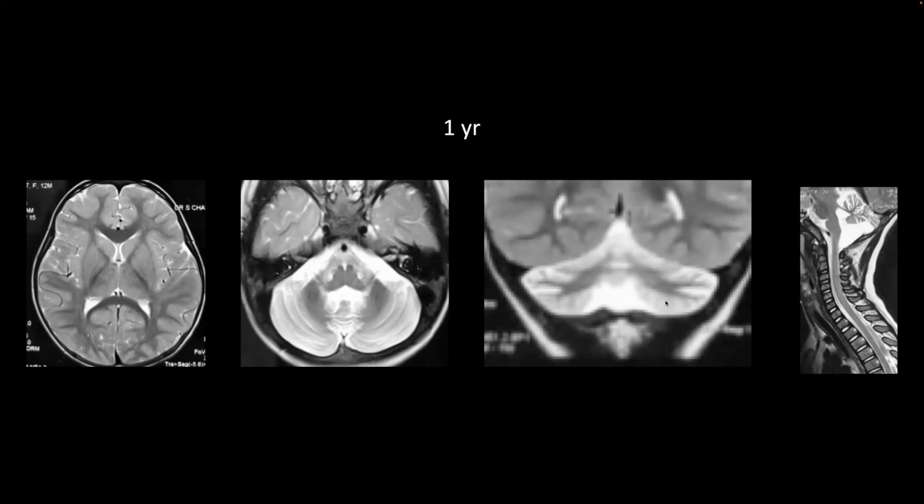I think the cortex is also slightly hyperintense on the T2 sequence, better appreciated on the coronal sequence over there. The spinal cord, at least the cervical and the upper thoracic cord, did not demonstrate any volume loss. Again, on the sagittal images, you can appreciate the vermis demonstrating significant atrophic changes, or it is hypoplastic, based off only one single scan.